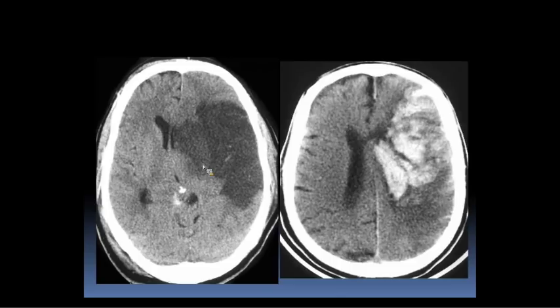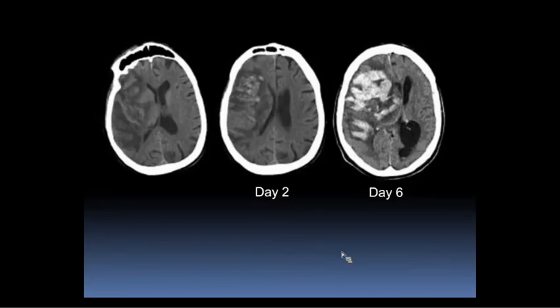And this is the patient a few days later, frank hematoma. So this is not petechial hemorrhage, of course. This is a big frank hematoma, very devastating kind of outcome. And this is just a little bit of progression of sometimes how these things occur. First, you can have some streaky hyperdensities that are just along the cortex. In this case, they become a little bit more confluent after a couple of days, and this person then developed a really massive frank hematoma involving basically the entire MCA territory.